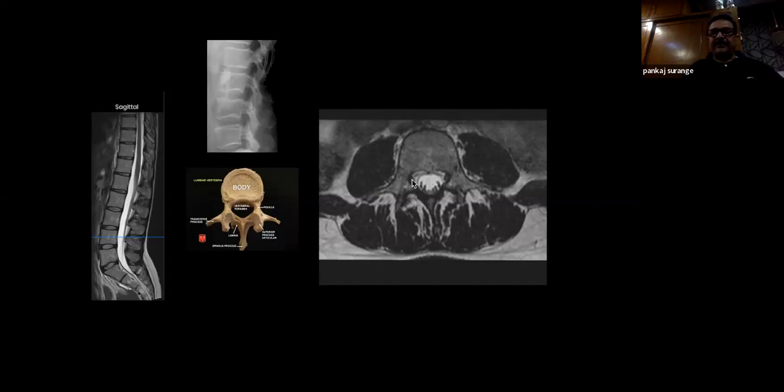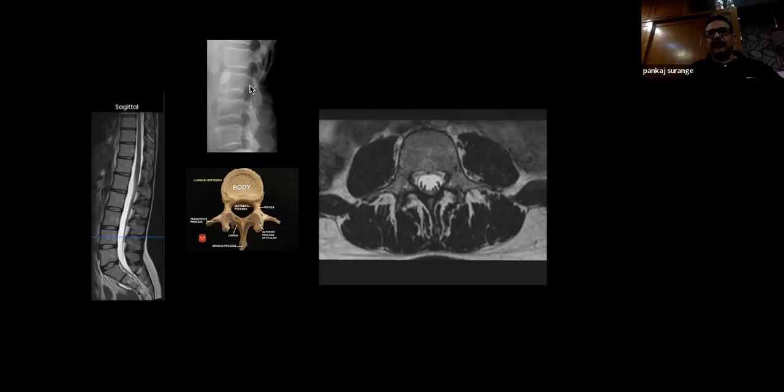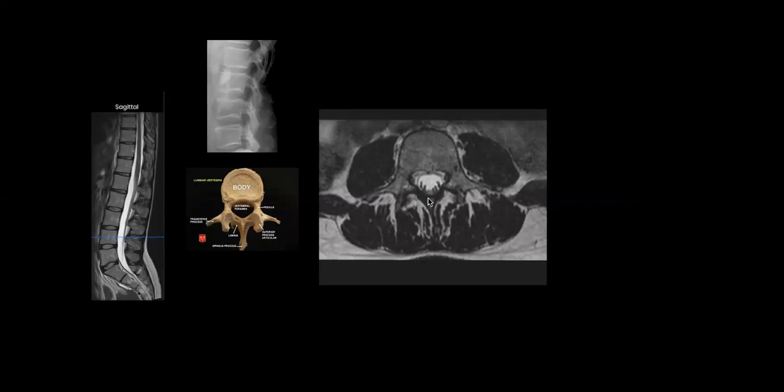And if you look at this, just medial to the pedicle, there's a dot structure here, which is your exiting roots. Okay, so exiting roots, as they go close to the foramen, they start going out of the dural sac. That's why we can see these nerve roots outside the dural sac, because now we are going towards the foramen side. This section is taken from here. Understood? Clear? And what is this darker structure? Ligamentum flavum. Okay, perfect.